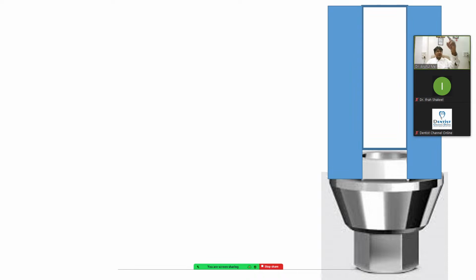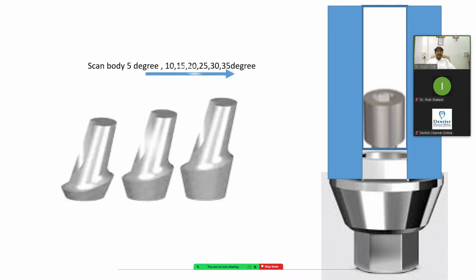Now the prosthetic has a non-hex, one link like the center abutment, and then your implant. So the inner part of the abutment has a hex and the outer is non-hex. So now when you insert the prosthetic and you insert the screw, it becomes one part. This blue color is my prosthetic which is non-hex, and the abutment, and inside the implant the hex, and both assembly is connected with the implant with a single screw. So now the implant is hex but the prosthetic is non-hex, so I am taking both advantages in this case. And along with that they are providing the angulation solutions also.